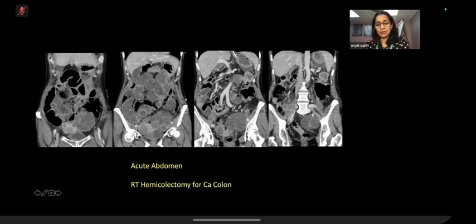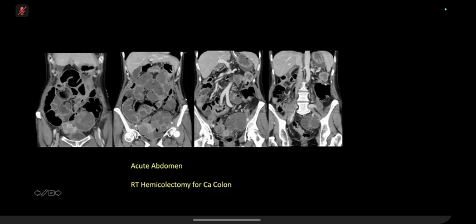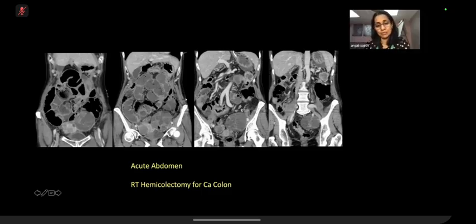This patient has a background of CA colon, isn't it? So when you see, with a background of CA, bilateral adnexal tumors like this, which are looking aggressive, malignant looking tumors, so what do you think? What do you suspect these are? Krukenberg tumors. Yes, and Krukenberg tumors are metastasis to ovary, and the most common from GI malignancy.